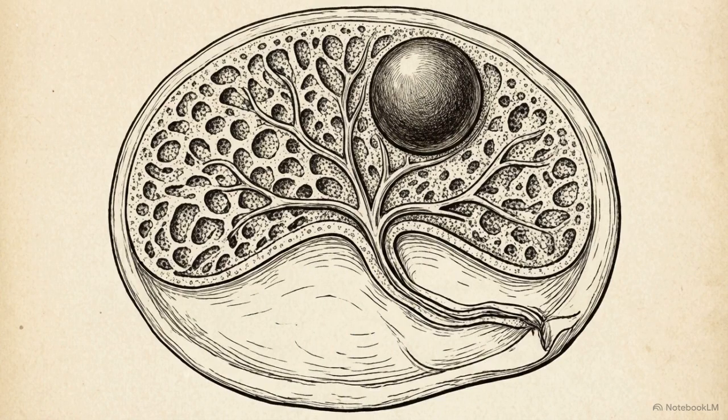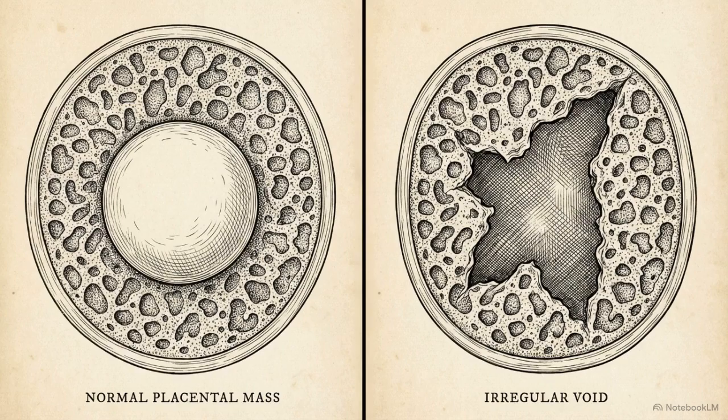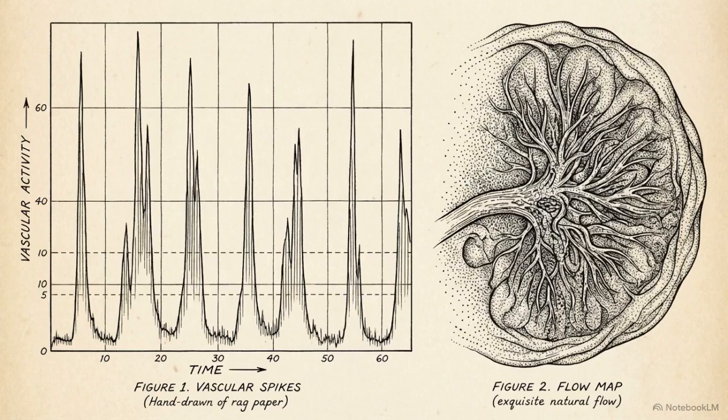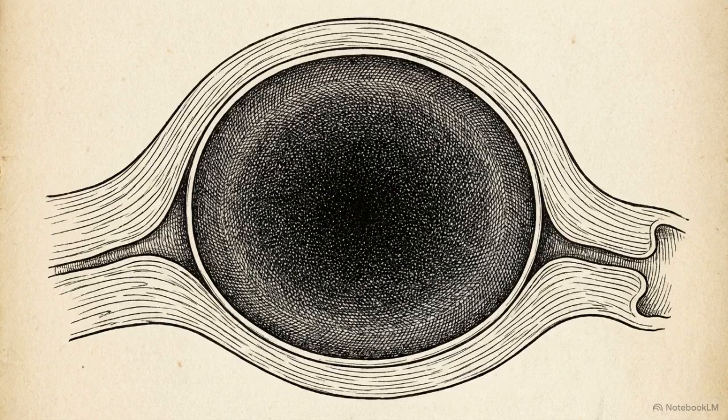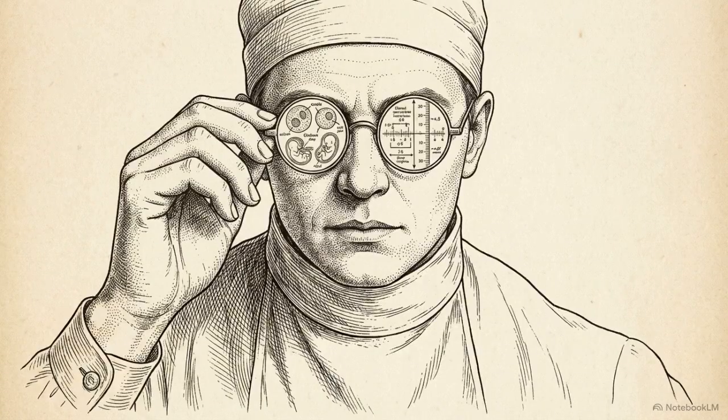When evaluating the placental structure, you may also encounter focal masses near the cord insertion. It is critical to distinguish a benign chorioangioma from a dangerous internal hematoma. The definitive test relies on vascularity. A chorioangioma is a benign fetal tumor. Doppler ultrasound will reveal pulsatile flow synchronized to the fetal heart rate. A hematoma, however, is entirely avascular. By rigorously interrogating the retroplacental interface with these parameters, a sonographer can instantly separate a harmless structural variant from an imminent catastrophic hemorrhage.